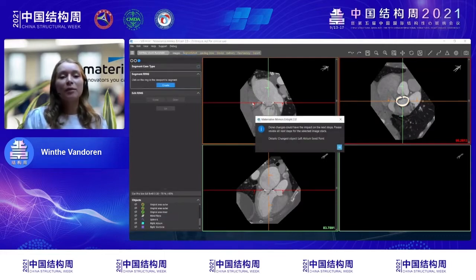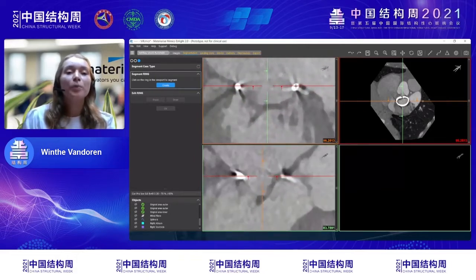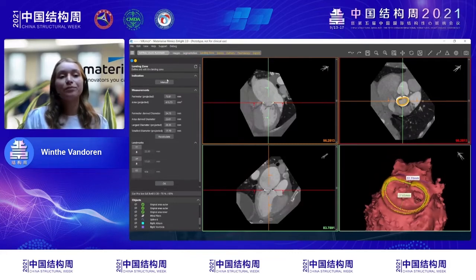I will reset this step for you and we get a pop-up saying that we skipped the workflow, and you see these steps turned yellow. This is a protection that we have in the workflow. And so what you have right here now is you can easily segment that ring that is in place. So I will give it 1 click and you see right here, my ring popped up. So now I'm fully ready. I've segmented my heart, I've segmented my ring, and I'm ready to start analyzing.